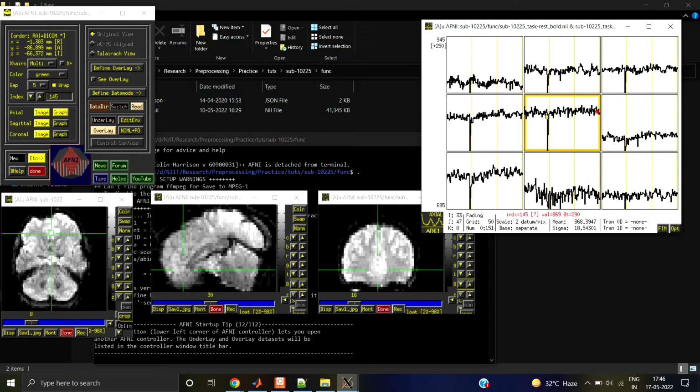But look what happens when we come over here at this dip. Okay, so here we are changing, till here it is okay. As soon as I go across the dip, you see there is this motion. Are you able to see this? You can see this particular thing just goes up by a certain distance and then comes back down. This is the motion artifact that is faced in fMRI.